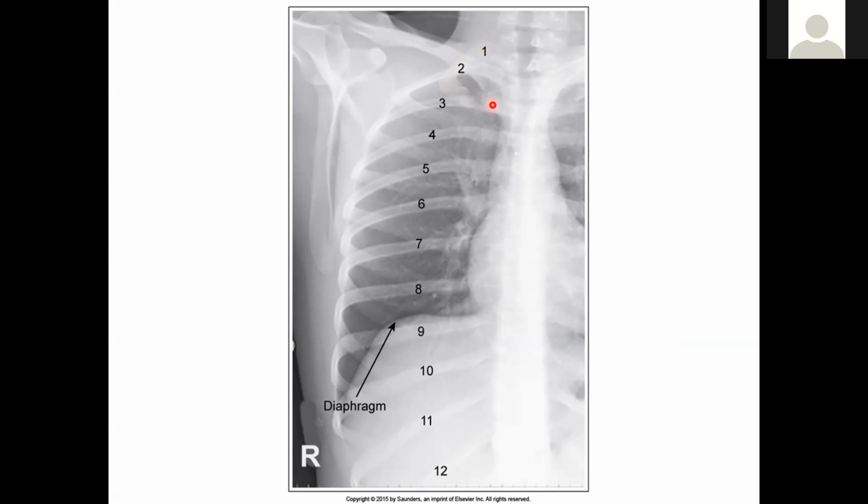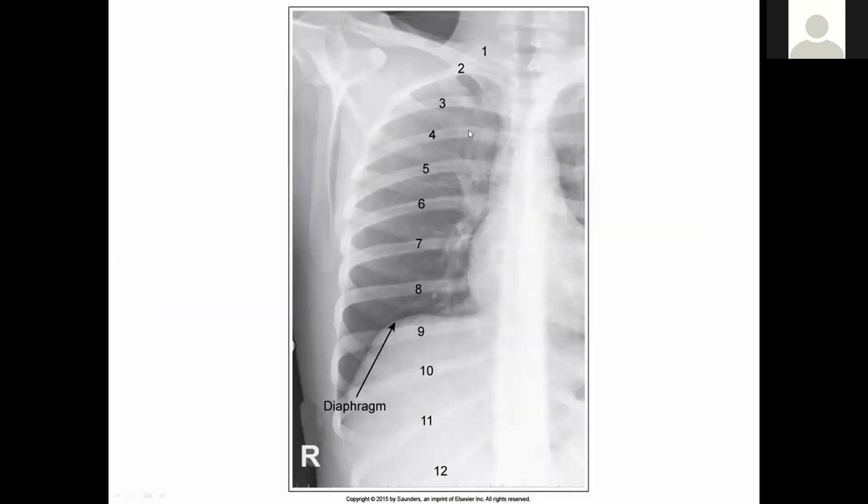The ribs originate by the spine. So you're looking at the posterior ribs here, and then they curl around and move anteriorly. So in terms of counting, it's always better, I've found, to start at the source and then follow it around to these anterior axillary ribs. It's difficult to count sometimes if you just try and go from here and here, which one you're actually looking at. So start at the source, and then follow that around.